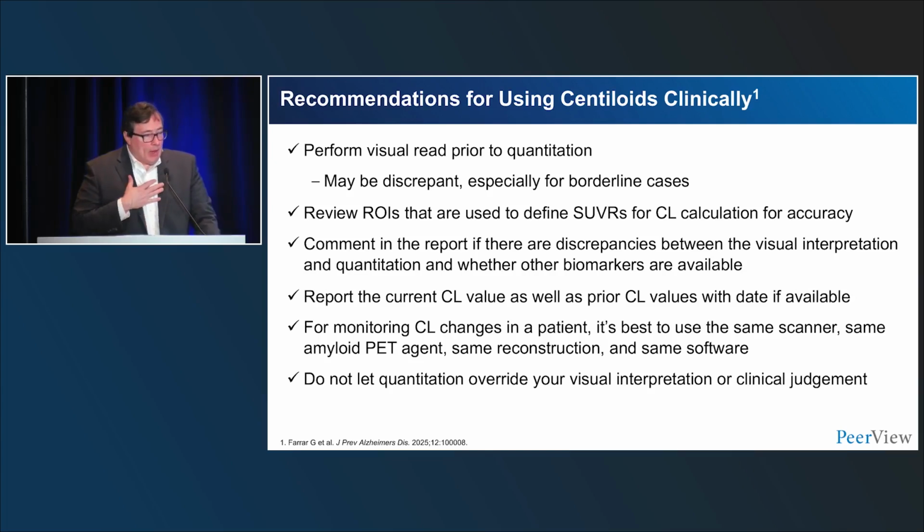So when I interpret these, and I recommend you do this, perform your visual read prior to quantitation, make up your mind. You may have discrepant cases, and we'll talk about how discrepancies can occur. This is especially true around the cutoff in the 10 to 30 range, but it can happen with other values as well.